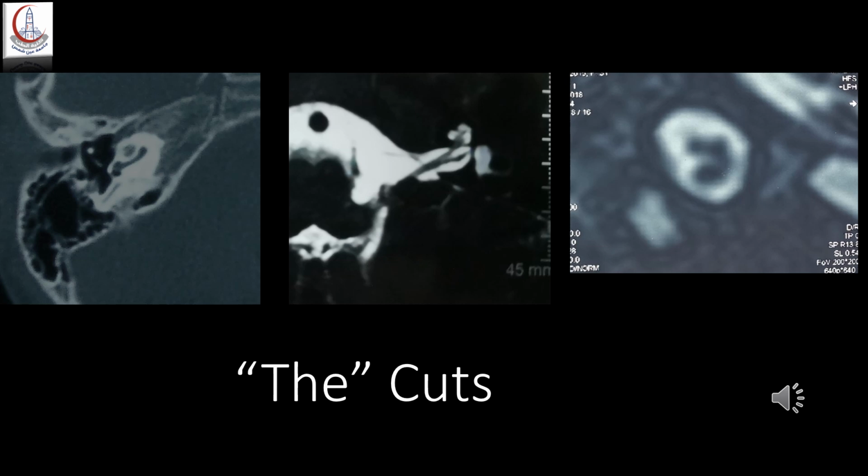If you find any problem in any of these, you have to go back and restudy in full detail each and every cut of your imaging. And if you are not quite sure about what you are seeing, feel free to reorder a CT or an MRI or both. Never undergo surgery until you are 100% sure of your anatomy, because we are dealing with a very critical surgery. And if we are not sure about what we are looking for, there is no way to discover and get a bad surprise.